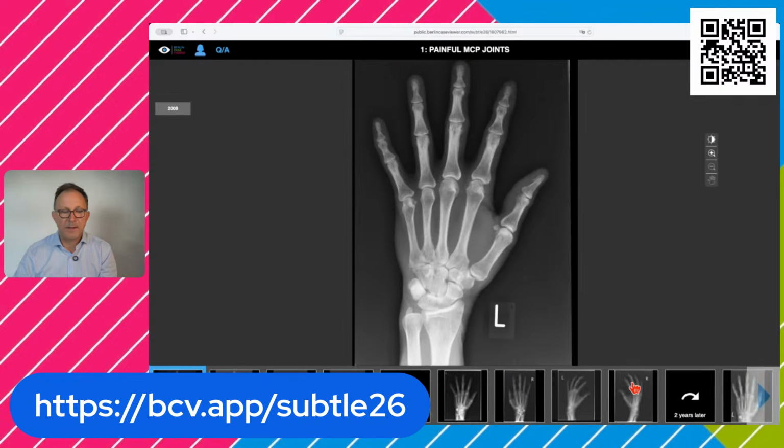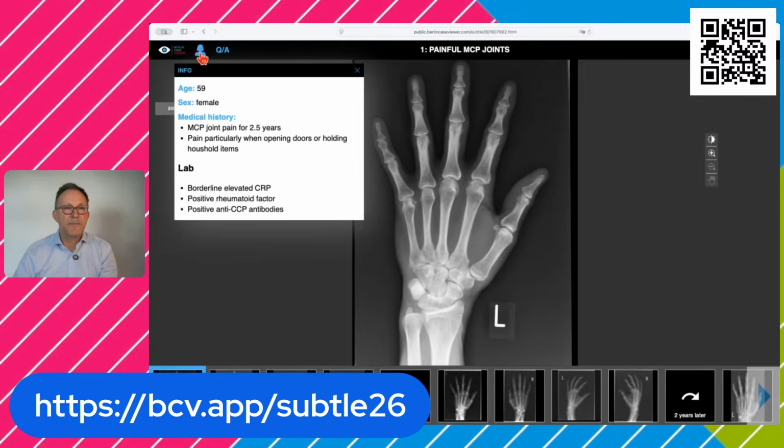I will present this case to you. At the time of first presentation, this is a 59-year-old woman who had pain in her MCP joints for about 2.5 years. Especially she was having problems when she opened the door, when she had a cup of tea in her hands, and did other household procedures.